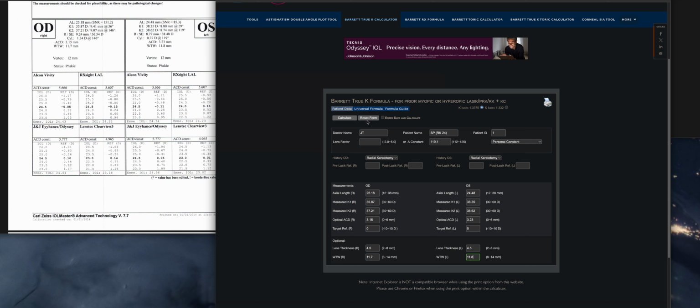All right, let's calculate here. Okay, I think it's finished. Right, go to universal formula.